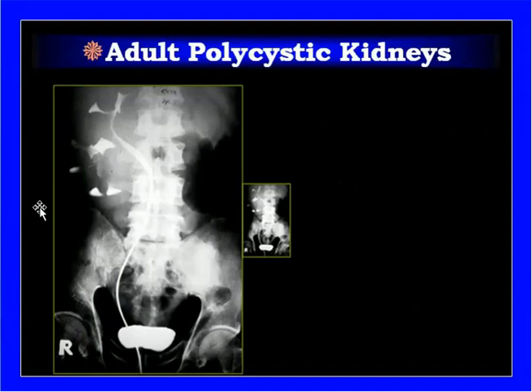Now this is the intravenous pyelography. Actually this is a retrograde outline of the system in which you can see the pelvicalyceal system is displaced because of the presence of the multiple cysts. We cannot make out a normal pelvicalyceal system.